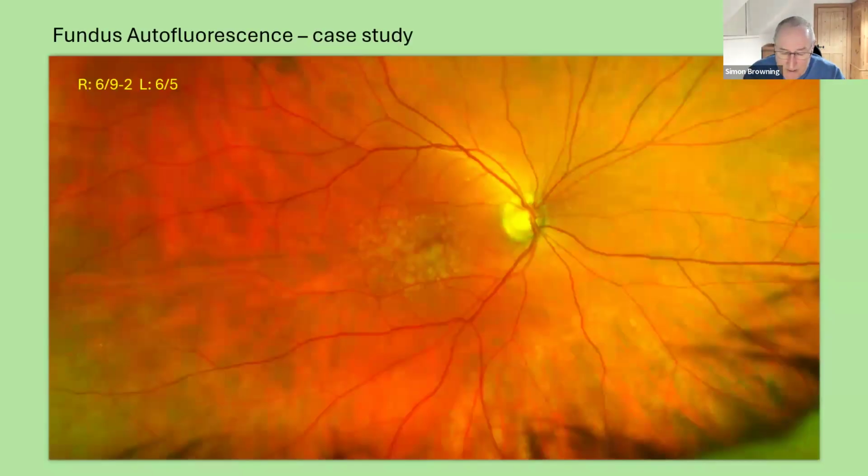So what I want to do now is just look at some case studies here and some different things that autofluorescence shows us. This is one of my favorite patients. I actually took this patient and another patient as a poster to the ARVO conference in Seattle a few years back, and then to the European Association as well the same year. And we were getting comments made there about, you can't do what you've just done. Well, we proved we could.